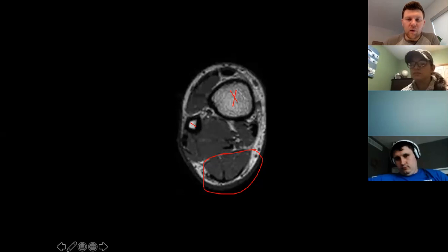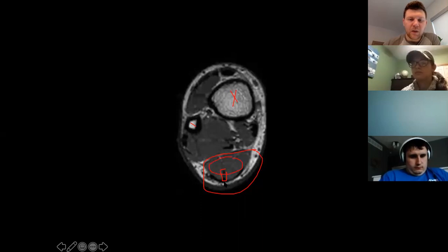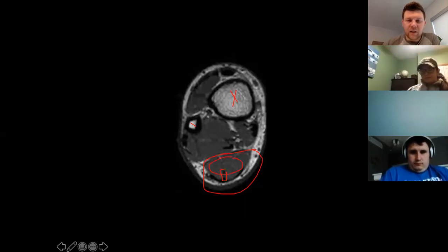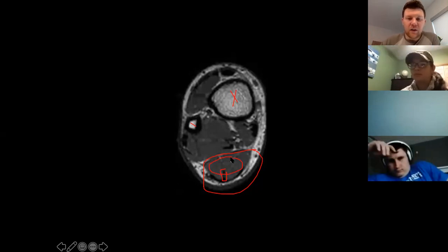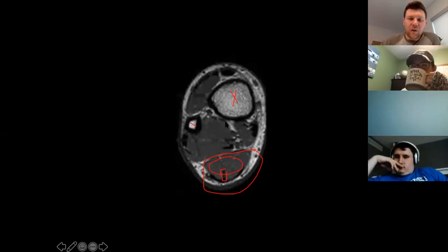And then what other muscle comes there? Soleus also. Good. And you can see right here where the septa is, the remnants of the two gastroc heads, and then the rest of it's the soleus in here. And you were right. Any tendon is going to be nice and black, and the Achilles is going to be thin at this part because everything is coming together before it really thickens. So if that's your superficial posterior group, where do you want to start next?